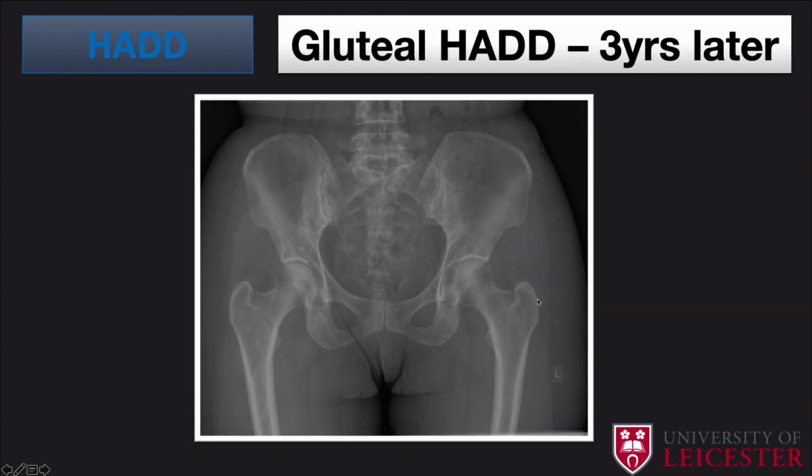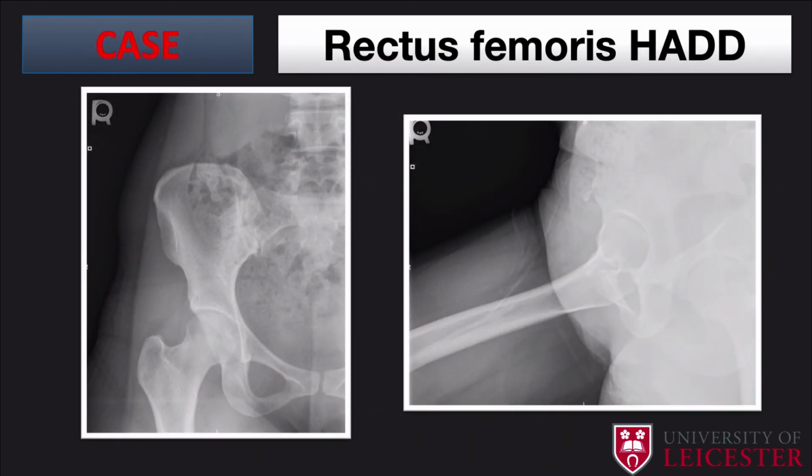The interesting thing about these conditions is, although the main differential includes degenerative enthesiopathic changes, you can see that the patient was re-imaged 3 years later, and it tends to just resolve. Your body just absorbs the amorphous calcification, whereas with a degenerative cause it is more likely for the abnormalities to stay present on this scan 3 years later. So just think sudden crystal deposition, which then disappears 3 or 4 days later, or even up to a few years later. Just think hydroxyapatite deposition disease.